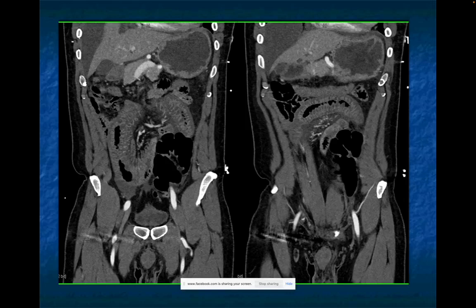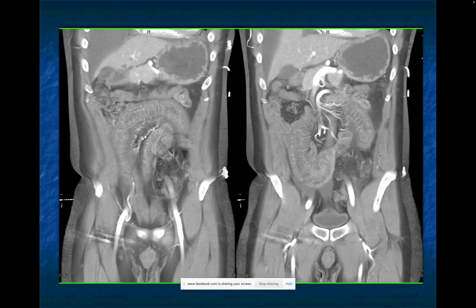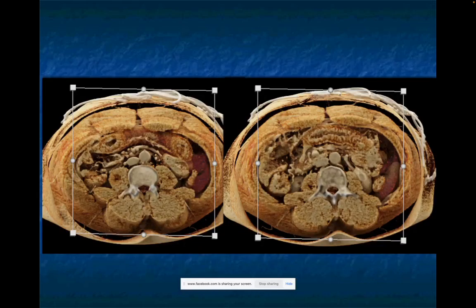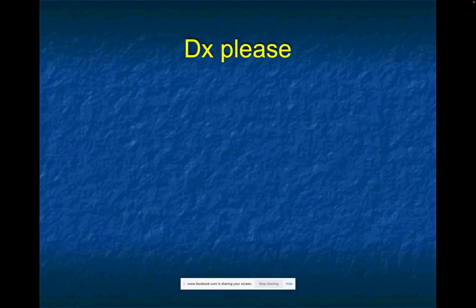Patient had radiation therapy, I think of that. Patient had graft versus host disease, if they had a bone marrow transplant, I think of that. Some severe enteritis, I would think of that as well. When you look here, the vessels are patent. The edematous changes of the bowel nicely seen on cinematic. So what are we dealing with here?